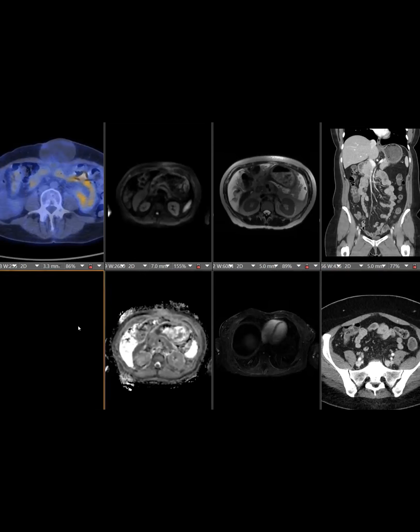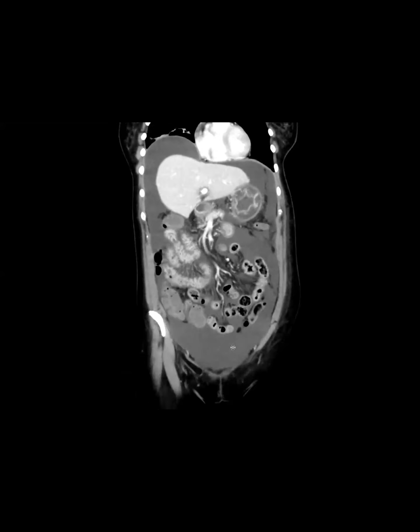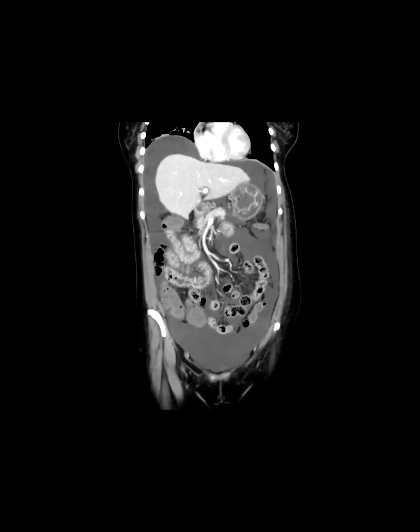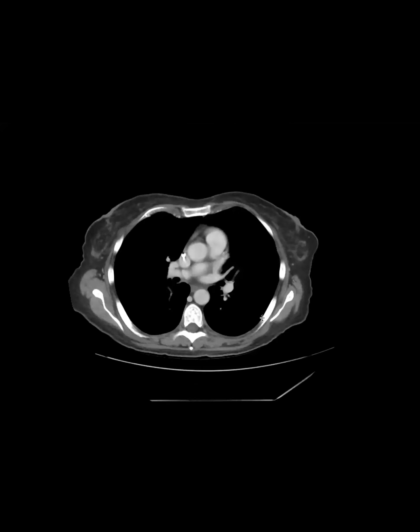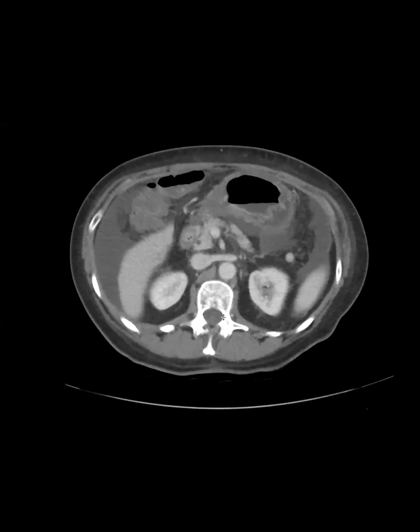The more distal ones are like retroperitoneal nodes below the renal veins, diaphragmatic nodes, retrocrural nodes, so anything a little bit further. And peritoneal disease should not be direct spread into the omentum. It should be a separate nodule, which can be a tough call though. But if in doubt, say it can be direct extension, and many of them will get a laparoscopic staging, and about 50% of those will actually have peritoneal disease on staging, I think.